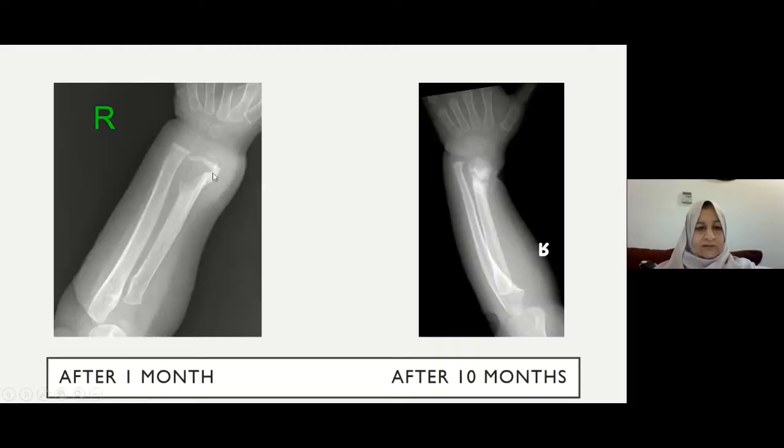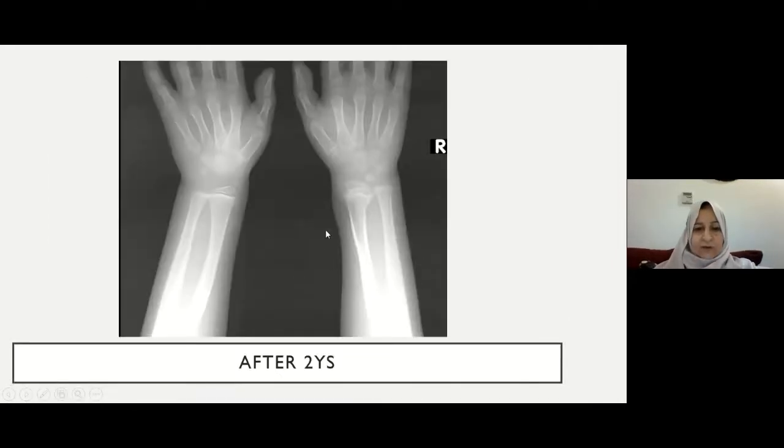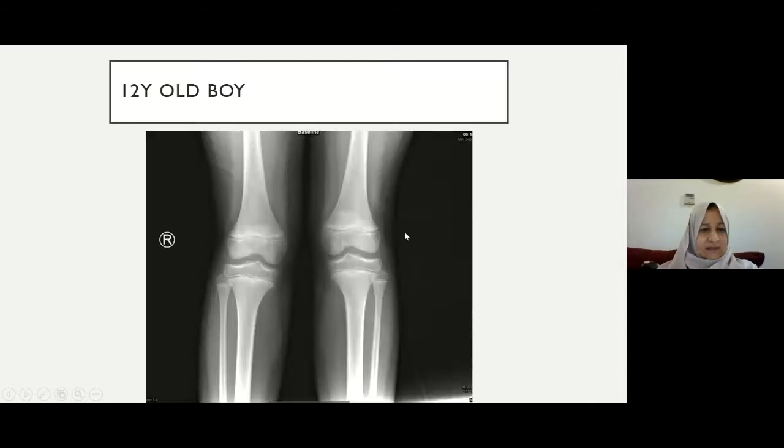He went for surgery. This is a post-operative bone defect, and he got a pathological fracture as a late complication. Follow-up in this case is very important because we have long-term complications such as shortening of the distal radius compared to the distal ulna and compared to the other side. Especially if we have this epiphyseal extension, you may have premature closure of the epiphysis. Not in this case. Next case, a 12-year-old boy who has signs of infection around the proximal right leg.